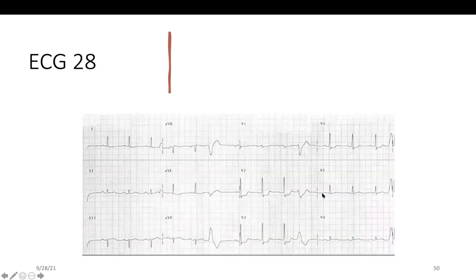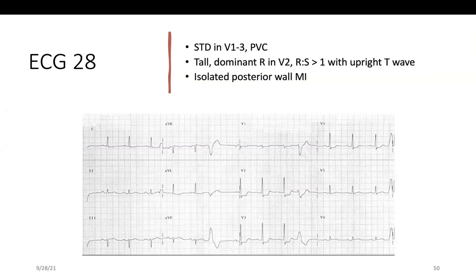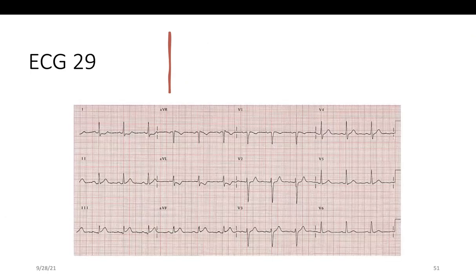Okay, what about this ECG? Prominent R wave and ST depression in V2, V3. So it goes with what? What do you think? With posterior. Excellent. See, you know, posterior MI is the most difficult to diagnose when it's isolated. So it needs high suspicion. We will not consider this an innocent finding or just ignore it. This is a posterior MI as you said. Excellent. Okay. 29.